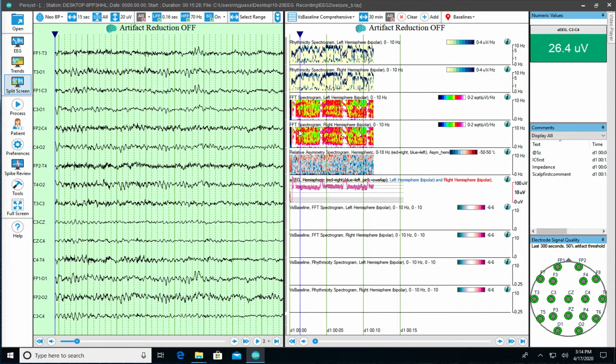It wants to wait until things settle down a bit before it sets a baseline, because if you have lots of variation in the baseline, as they used to say in the old days back in clinical chemistry, you could ride a horse through those ranges. So you want a baseline that doesn't have a tremendous amount of variation because otherwise nothing's going to vary much from that. Getting off the subject.